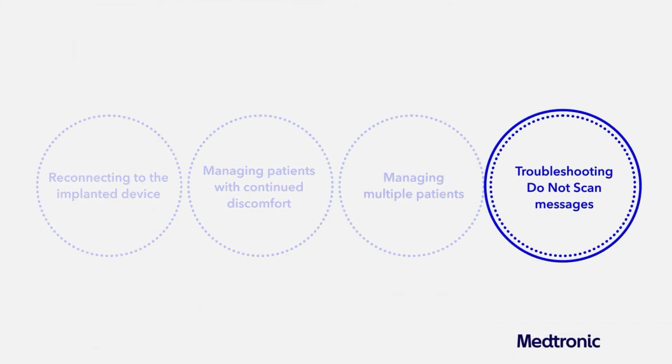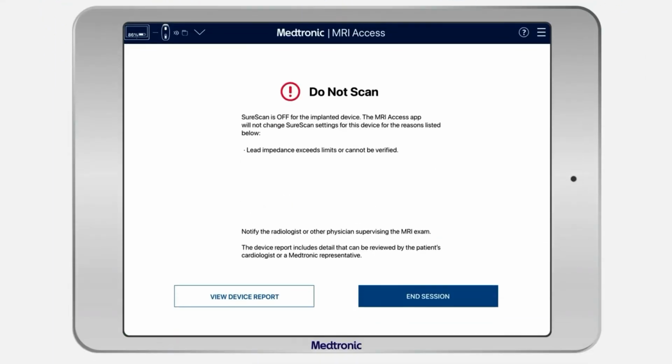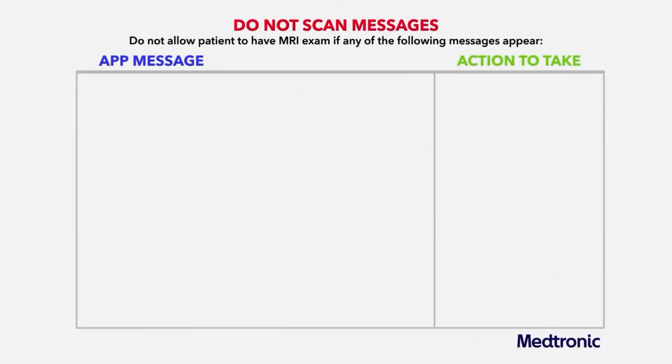Troubleshooting Do Not Scan messages. If the app determines that SureScan mode cannot be turned on, it will list the reason on the Do Not Scan screen. Do not complete the MRI exam until the prescribed actions are taken. There are several cases when you should not proceed with the MRI exam. If you see any of the following app messages, then do not allow the patient to receive an MRI exam.